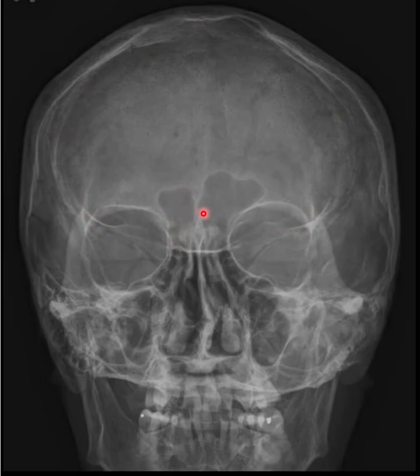Also, we can see the frontal sinuses, because this is going to identify and demonstrate the frontal bone for us. So we can see the frontal sinuses. We can see, of course, the petrous portion that we identified, the mastoid portion here that we identified, and the mastoid process and mastoid tip, the very bottom of the mastoids, and also the base of the skull here. So that's really what we look for in this, the Caldwell skull image. All of those structures are what's of most importance to be able to identify and demonstrate.